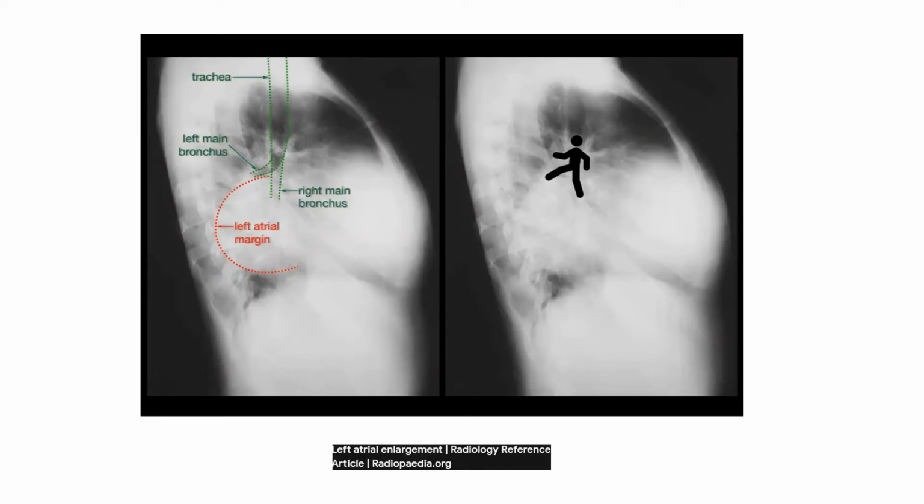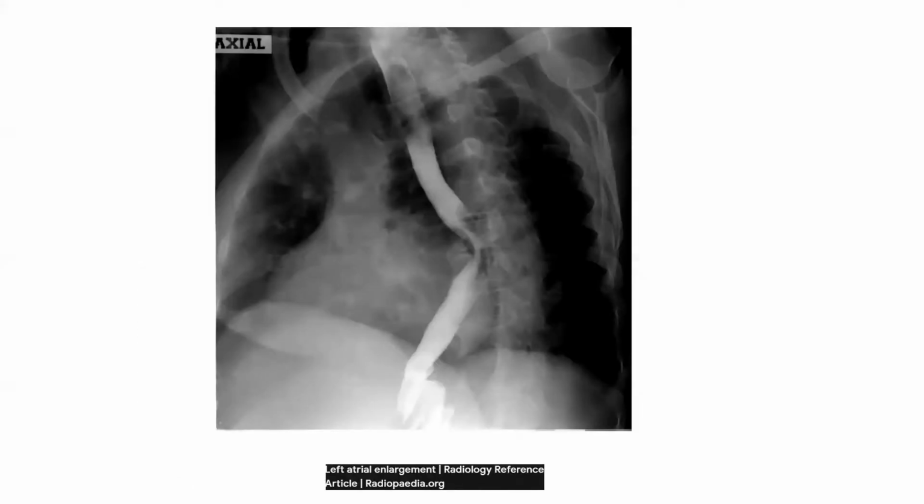Okay. And if the patient happens to have a barium swallow, the dilated left atrium might encroach upon the esophagus, leading to displacement and sometimes compression of the esophagus. So it can displace it and it can compress it. So a dilated left atrium can lead to dysphagia.